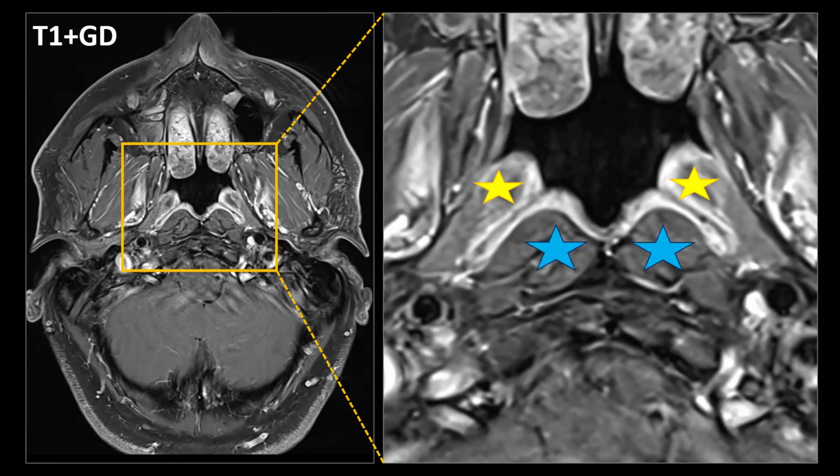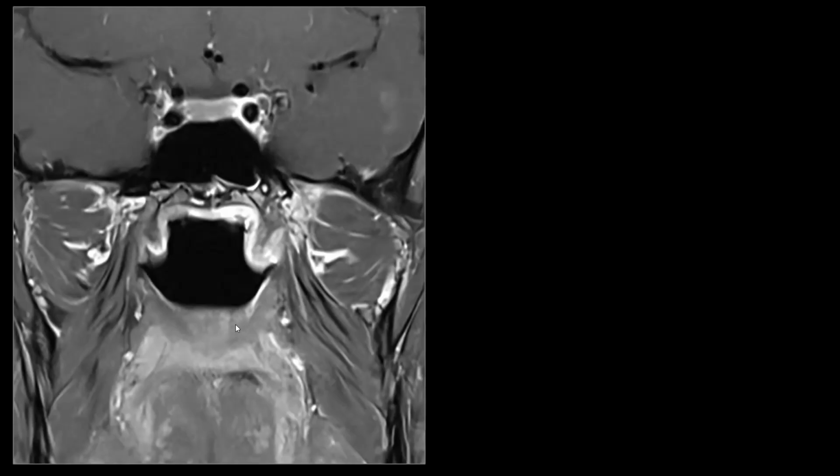And posteriorly, we see the longus capitis slash colli muscles causing these elevations of the posterior nasopharyngeal wall. And remember, these are located in another neck space, namely the prevertebral space. The Torus Tubarius, however, is located inside the nasopharynx. This is a magnified coronal image.